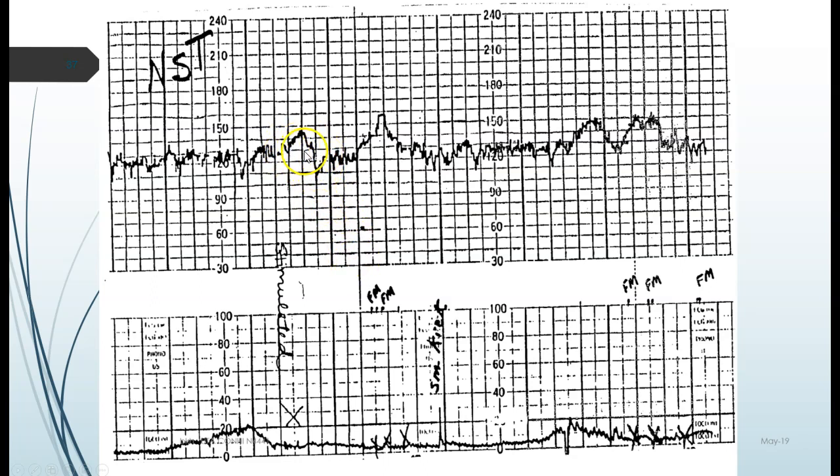That is not part of the baseline. This is not part of the baseline. This is not part of the baseline. Right here is our baseline. These little FM marks right here, that's fetal movement. Either mom said she felt baby move or the nurse standing at the bedside saw or felt baby move and they put it on the paper.